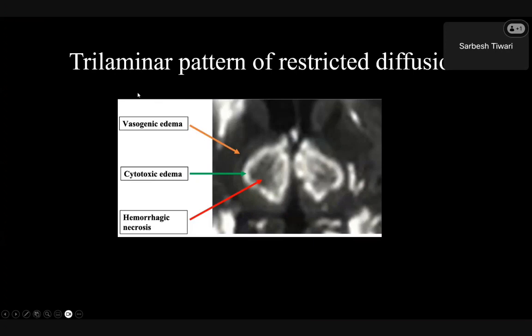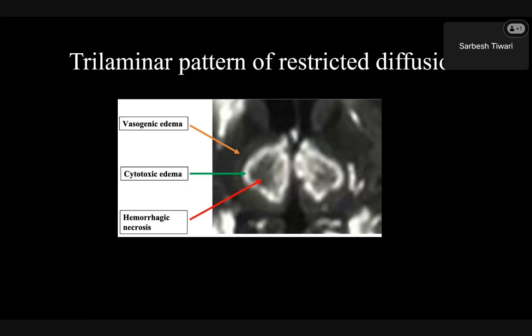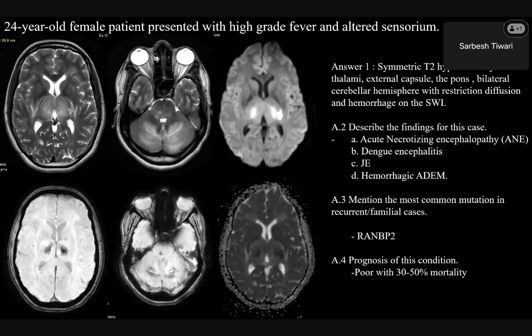Case 4. A very simple case. A 24-year-old female who has come with, tell me. Abscess. All right. Can somebody tell me where is the abscess located here in this particular case? GBM. All right. So GBM. So there are two abscess. So most of you guys are thinking about either it's an infective etiology or a malignant etiology of the left thalamus. All right.